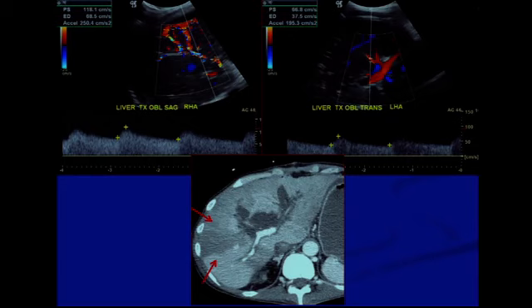Both in the right hepatic artery and the left hepatic artery, there is tardus parvus, and this patient had developed, as a result of ischemia, a leakage of bile, where you can see leaking of bile adjacent to the left and right hepatic ducts, and more distally a hepatic infarct. It's demarcated by the red arrows.